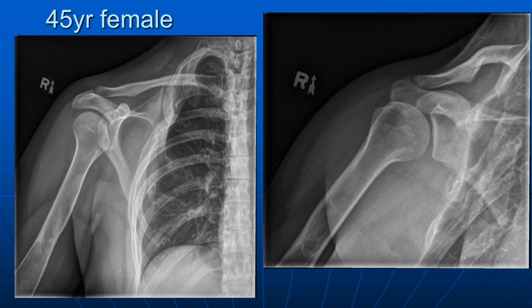This is nice. The thing that you need to see all of the bone to understand what's going on here. So this patient needs an X-ray of the whole humerus. It's difficult to say, isn't it, precisely what this is, because you need to see the whole bone. So this is one of those that doesn't really obey all the rules. You could say you could draw around it. There's no pathological fracture. There's no periosteal reaction. The bone is expanded. It looks very strange.